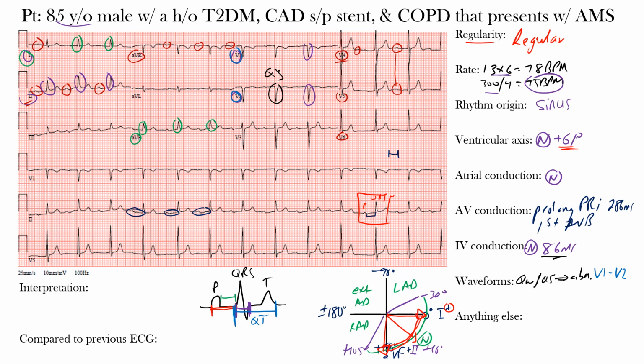Well, how about the R wave progression in the precordial leads? Normally, the R wave amplitude should progressively increase from leads V1 through V5. In this case, it seems like we don't actually see a true R wave until V3 in the precordial leads, which is not normal. This diminishment in the anteroseptal forces may suggest a possible prior anteroseptal infarct that we mentioned earlier, okay? So this is something important, and it can help point you to these may actually, in fact, be real Q waves of significance.